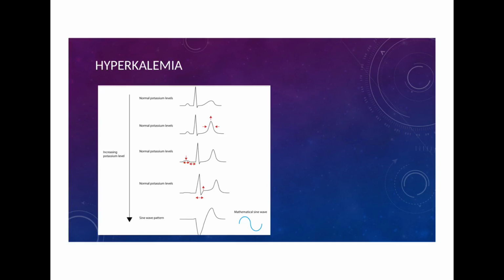Okay. Now to finish off, we'll talk about two common problems that would appear with ECG manifestations, and getting an ECG would very much affect the management of these patients. One is hyperkalemia. So whenever a patient comes in and you either suspect or find on their blood work that they're hyperkalemic, you'll want to order an ECG right away to look for certain changes.